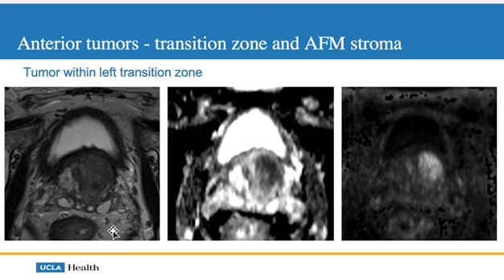And when you look, sorry, I've sort of switched the image, the typical sequence that I've been putting these in. So this is our T2. Here's the DWI, and it's DWI because this area is hyperintense. So there's a hyperintensity on DWI and a corresponding hypointensity on the ADC. And so this tumor was biopsied, found to be a Gleason 4+3.